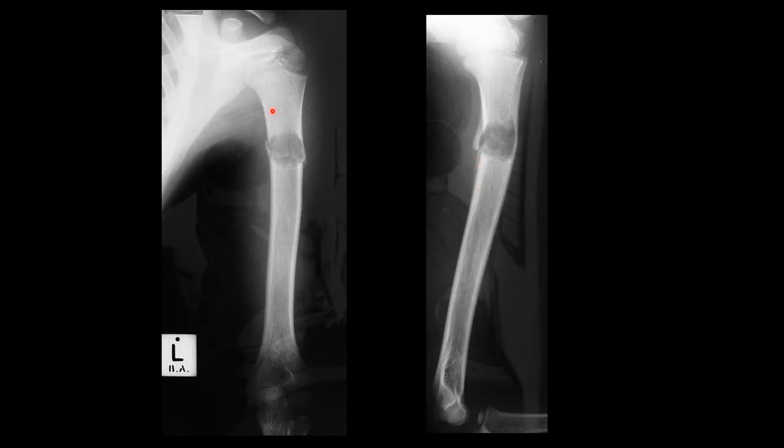This is an example of a simple bone cyst, which is a benign lesion, typically seen in humeri of children, and that's why it's important to recognize that this is a child. It often presents when it fractures due to it weakening the bone, while playing or being yanked on the arm. Else it is incidentally located when a child has an x-ray, a chest x-ray for instance, for some other reason, and it's noted on the side.